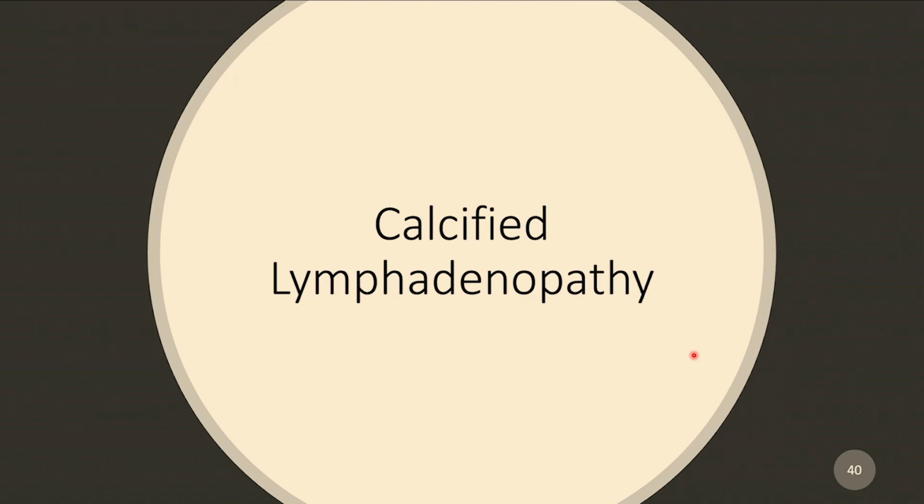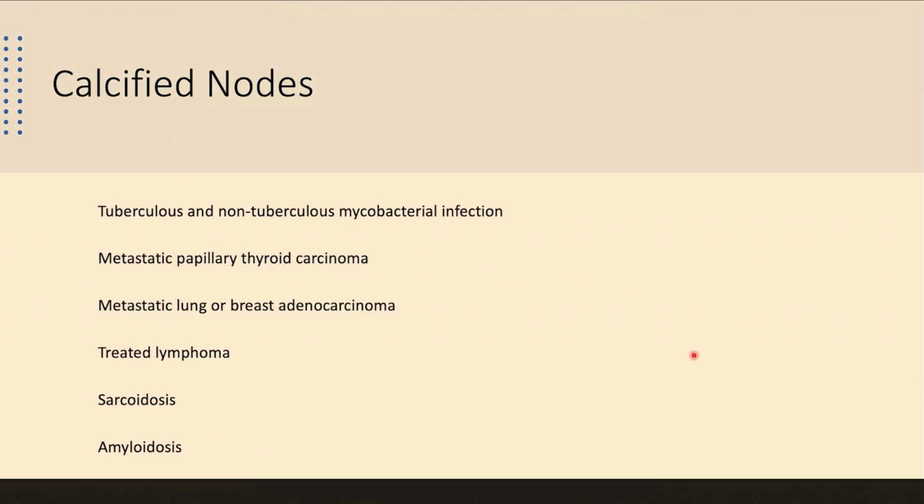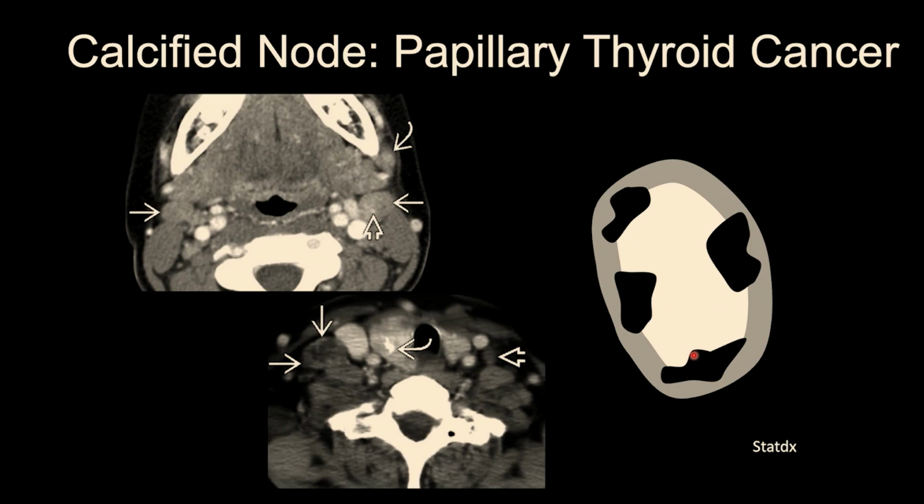Morphology is king. I see a lymph node now, it's partially calcified or has punctate calcifications in it. This is your differential diagnosis for punctate calcifications in lymph nodes. Okay, we like to blow these lymph nodes off as all mycobacterial infections or granulomatous disease. Definitely not. There's a long list of differential for partially calcified lymph nodes. Here's some examples. These are punctate calcifications in lymph nodes. You can see one right there, the open arrow. The other ones are just showing you the nodes.